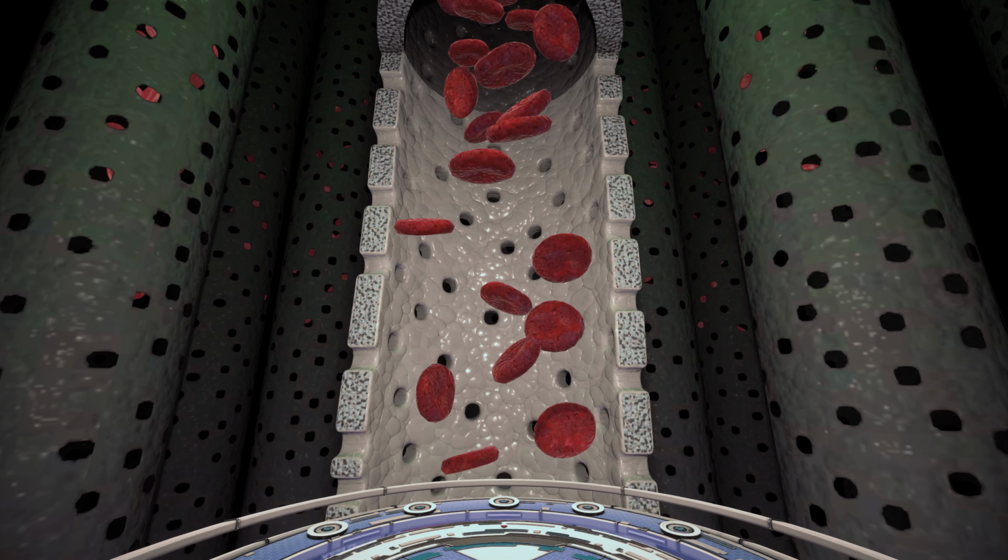As we mentioned earlier in the clinic, dialysate is a prescribed mixture of purified water, acid, a bicarbonate buffer, and electrolytes. Excess water and wastes pass through the pores of the dialyzer and into the dialysate. The nephrologist can tailor the dialysate to meet a patient's needs. For example, when there is less potassium in the dialysate, more will be removed from the patient's blood, which can allow a patient to eat more healthy fruits and vegetables. Dialysate flows countercurrent to the blood. This means in the opposite direction.